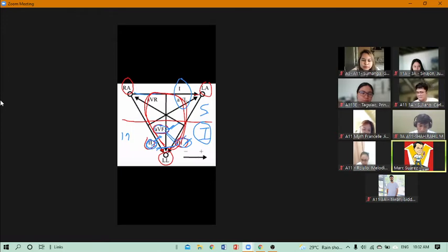So what goes below, the same occurs above. If you see ST segment elevation in lead 1, what does that tell you? However, in aVL there is none. So we still follow the all or none principle. That ST elevation appreciated in lead 1 is not significant.